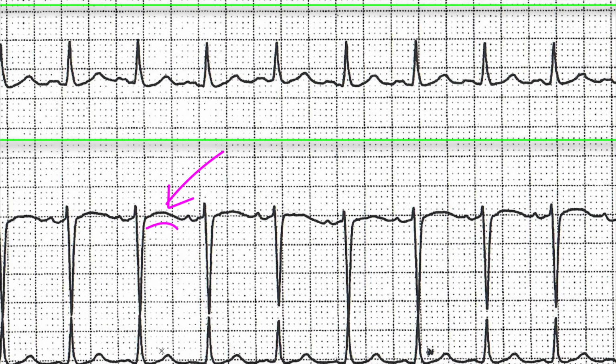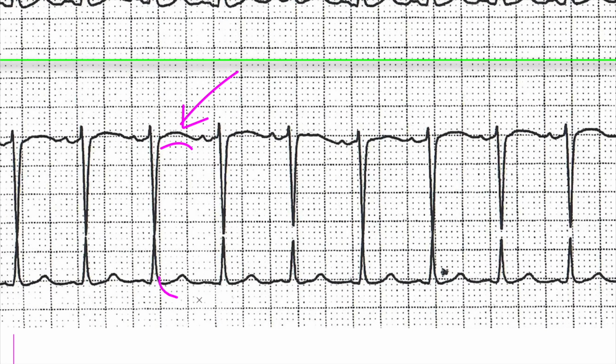It's kind of flat. It doesn't have a very characteristic morphology, right? So my mind immediately goes to potassium, electrolytes in general, but potassium here, and I'll be double checking that on the 12-lead ECG. The size of this S wave, look at this, the size of this S wave is kind of big, 5, 10, 15, roughly 17 millimeters. The huge S wave here, my mind immediately goes to LVH, left ventricular hypertrophy, or left bundle branch block.